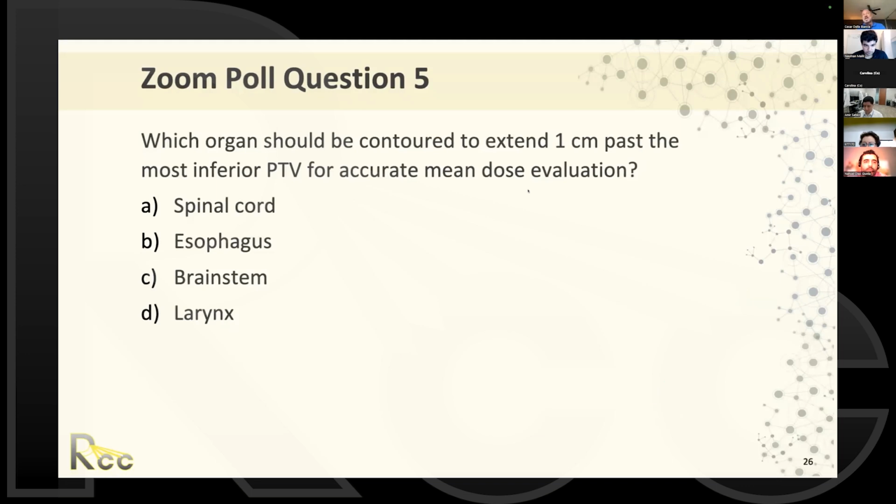So basically, I don't think we have a precise centimeter margin, but in areas that are very homogeneous, I would say that the 50% should follow the shape of the PTV as close as possible, within 1 to 2 centimeters, because physically that's possible. Less than that, it would become an SBRT plan, which is not the case here.